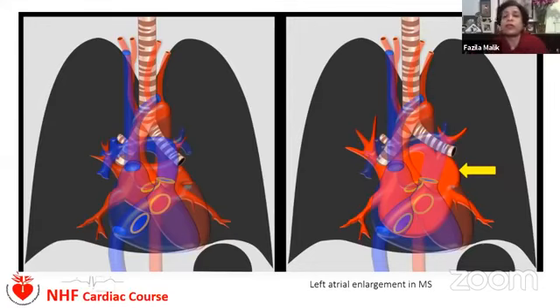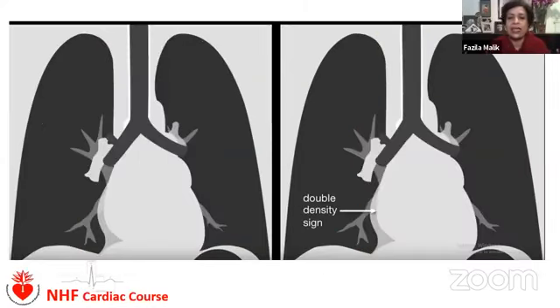So the most important thing happening is that due to the valve stenosis, blood is not flowing from the left atrium to the left ventricle, so the left atrium is really increasing in size. How do we understand radiologically that the left atrium is increased in size? Well, it grows everywhere, towards the right, the left, upwards. When the left atrium grows towards the right border, which Dhiman has already said is formed by the right atrium, the enlarged left atrial border itself forms a separate silhouette.